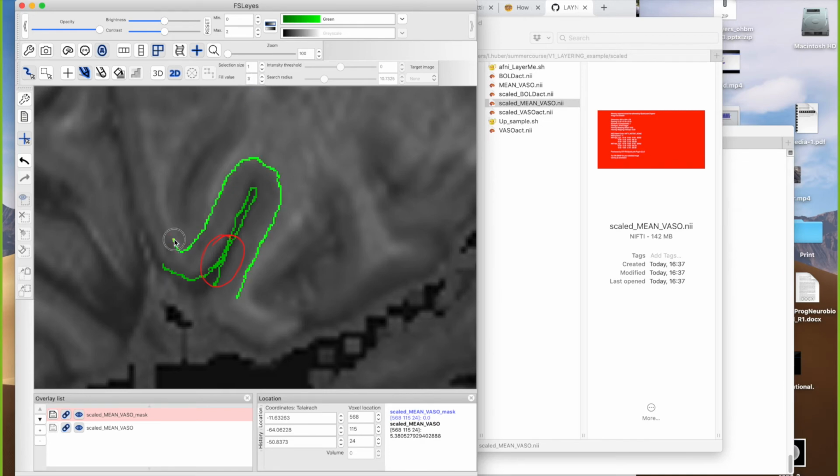You can include them later in post-processing by drawing the values, looking at the RIM data. Maybe something for a future blog post, or maybe to have it optional in LN2 layers. Yeah, this time I was lazy to implement it as an optional flag.